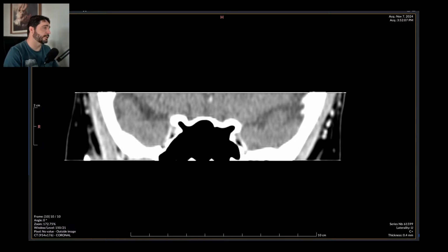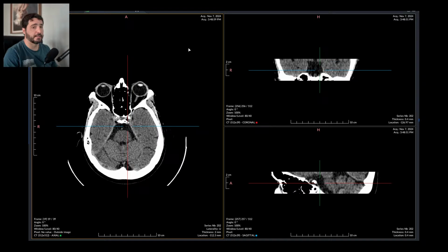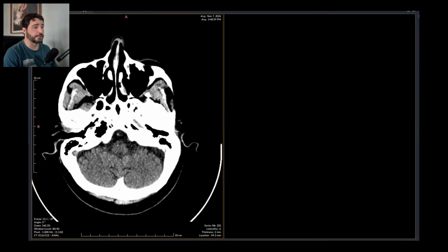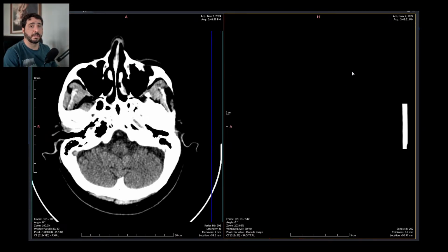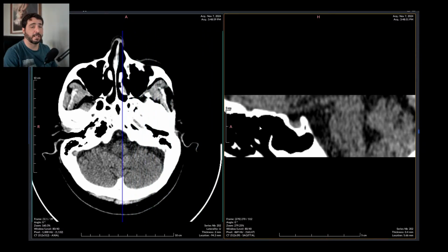This is a CT scan of the Turkish sella, the hypophysis, the pituitary gland. This is a useless exam. It never served any purpose besides making money for the clinic that does it, because you really can't see lesions on a CT scan. Most of the pituitary lesions are completely absent on CT scans such as this.